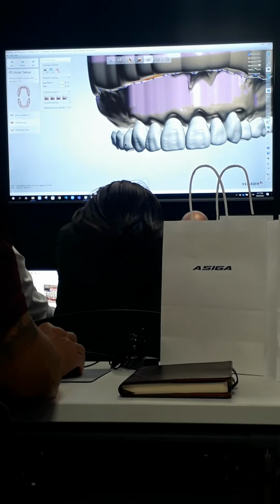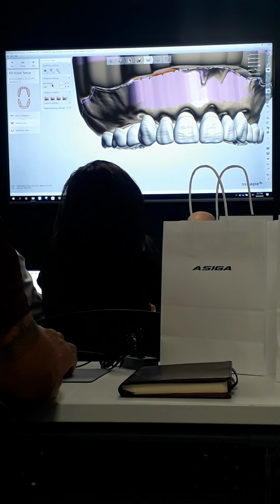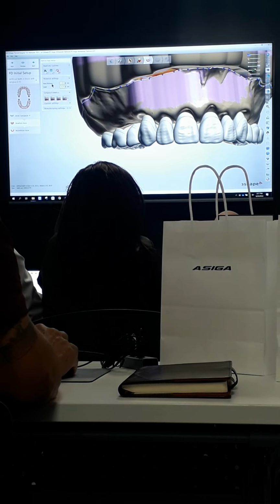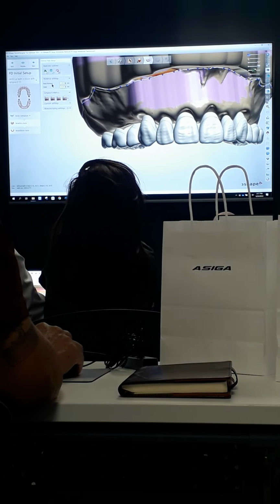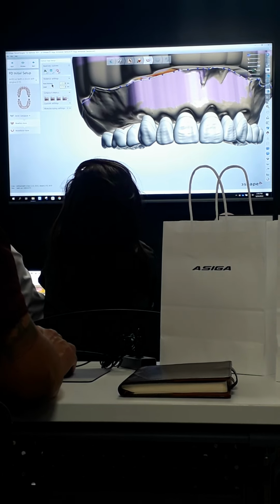So everything looks good now. And then I have my base thickness that I need to set. You need to know what the minimum thickness of the material that you're using is. So this is your gingiva based material. You would obviously get that from Dentsply or the Lucitone materials. You would enter that in here, and then it would set that minimum thickness at that value. So you don't have to worry about it being too thin in any areas.